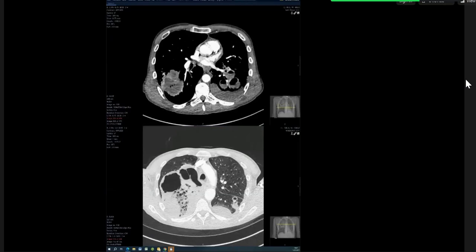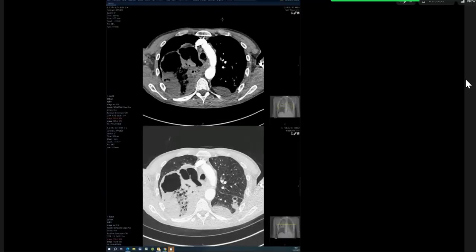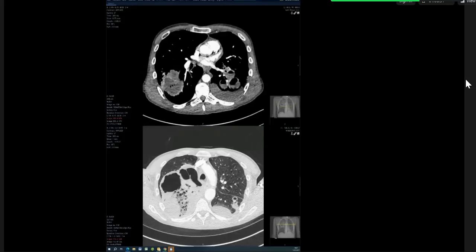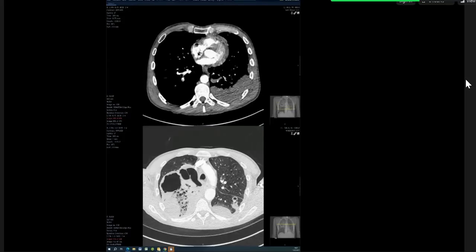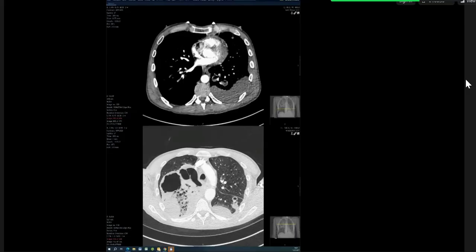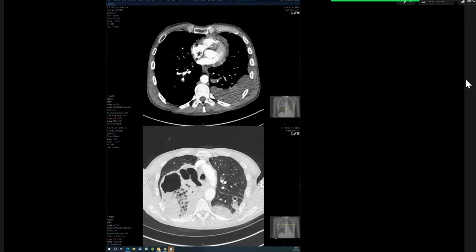Okay. Hydatid cyst may be one, but not typical because I can't see the water lily sign in the regions. Maybe necrotizing pneumonia. Anything else in the lung? In the CT? I can see that there is opacity in the left lung, that one that you were scrolling over. I just want to exclude that there is any communication with the abdominal cavity.